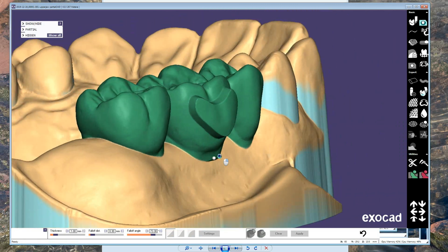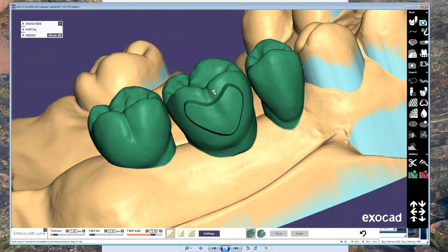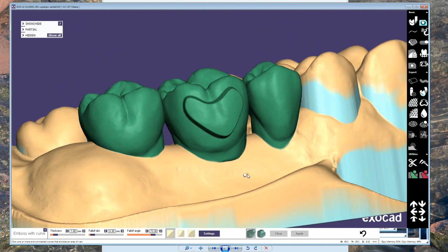And so now it adds a nice offset. If you don't use any offset, it makes a straight fall off, which is fine. But to have it a little bit smooth like this gives you a nicer effect. Also, sometimes if you go through these areas where there's a divot or a sharp change in the surface, and it doesn't look quite right, you can change some of these settings as to how it does the offset to get a nice result. Or you can just fix it with smoothing.